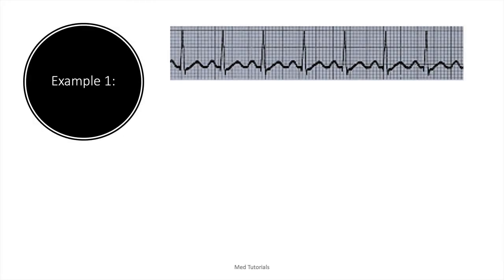So we're going to look into a few examples now. What I'd like you to do is probably pause the video and try out these examples, and then we'll see the answer together.